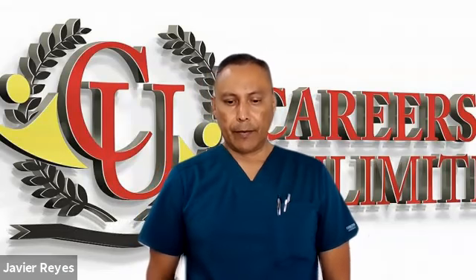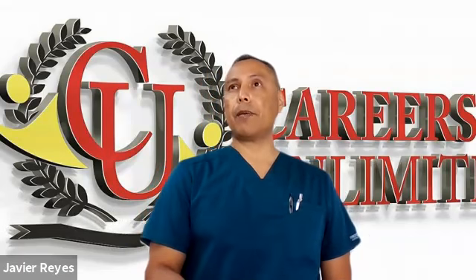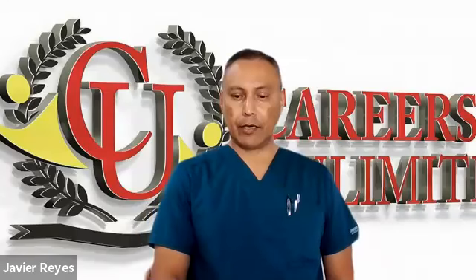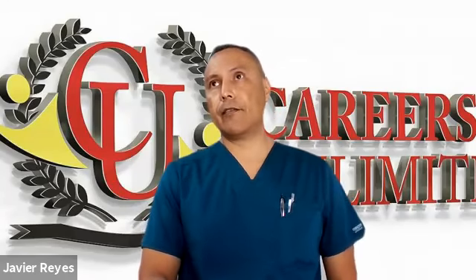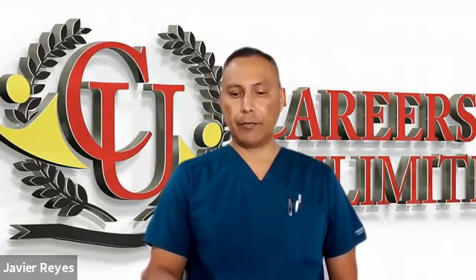If the majority of the QRSs that you see are positive but wide, then you call it a right bundle branch. If they're mainly negative, you call it a left bundle branch. See QS, QS, QS, it would be negative.